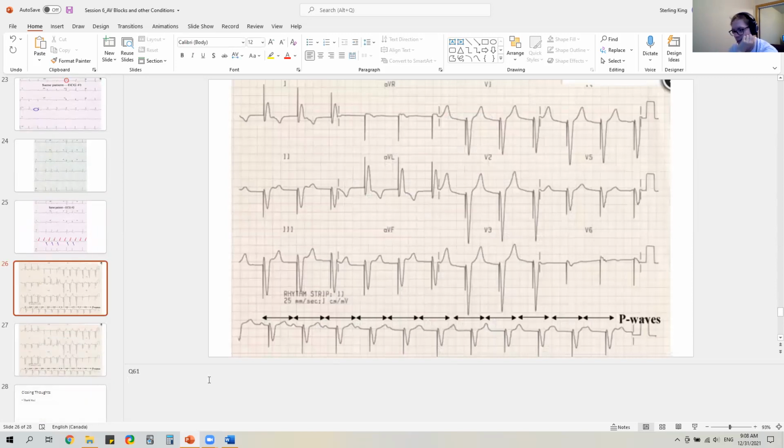Right, next question, question 61. So go ahead and start. I'll start here. So rate, so let's go 1, 2, 3, 4, 5, 6, 7, 8, 9, 10, 11. So 66 rate if it's a 10-second ECG, 300, 150, 100, 75. And it's a little bit lower than 75, so that sounds right. Axis, up, normal. Rhythm, well, if I see a big spike, I know it's a pacemaker, so pacemaker.